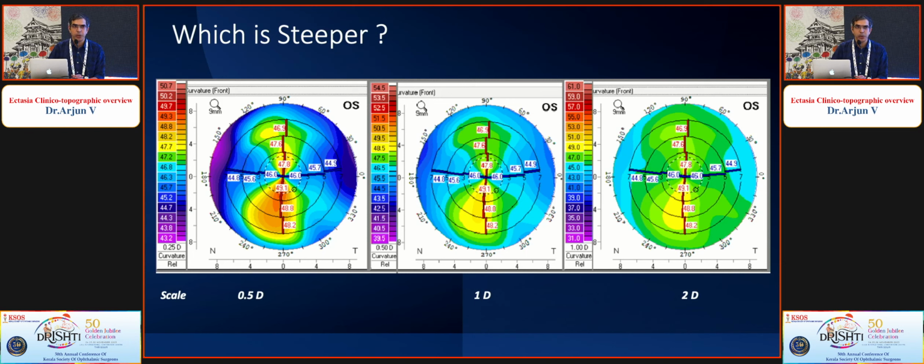So in the keratometric map, one more thing you have to see is the strategy used. Just a brief overview, the two strategies you can use are the sagittal or axial map, or the instantaneous or tangential map. In an eye like this, there are subtle areas of elevations, and when you try to take a map out of it, your axial map will only generalize the whole map, but it will not show you the subtle variations. So you have to find out the tangential map, in which the subtle variations are represented by the different radii of curvature. In other words, to get a general overview, you can use an axial map. To find out surface variations, you can use a tangential map.